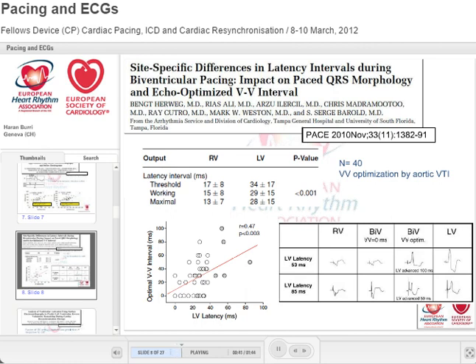And the reason why you may have this in some patients is that in some patients we have latency. That's to say, if you pace the LV only, between the LV spike and the actual rapid QRS deflection, there may be a close to isoelectric line. And this is because the LV may be positioned in an area with scar. And that means that you'll have slow conduction there. So you have LV pacing, you have local capture in the scar, it goes through slowly, and then it gets conducted more rapidly. So the left ventricle pacing will have more difficulty in expressing itself.